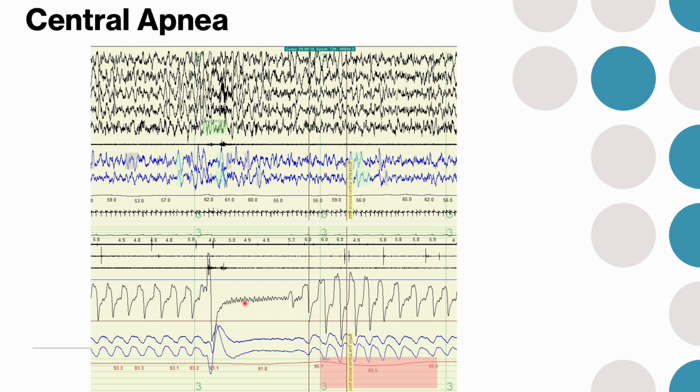after you take a big breath in, usually you don't breathe for a little bit because you took in enough air for a few breaths and you don't need to breathe anymore. That's a normal physiological thing. Sometimes it's associated with a desaturation. This is a very controversial issue amongst doctors and sleep technologists. Do you score these or not?